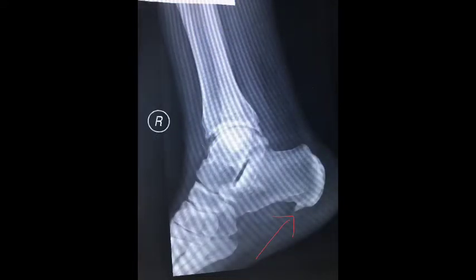The red arrow points to the calcaneal spur. The calcaneal spur is the pathology found on this case. Calcaneal spur, sometimes called heel spur syndrome, is a bony outgrowth built up by tiny calcium deposits that can be found in the underside of the foot. It can be sometimes confused with plantar fasciitis, but the difference is that calcaneal spur is a bony protrusion or a bone bump, while plantar fasciitis is swelling of the thick band of tissues that run from your toes to the heel of your foot.